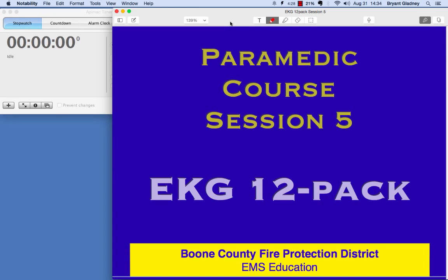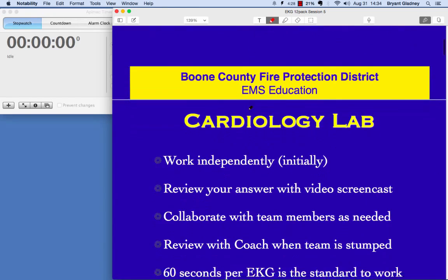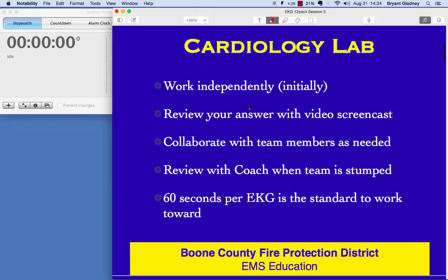Okay, here's an EKG 12-pack for session 5 of the paramedic course. This is a cardiology lab session. We're going to work independently to start with, and then review your answer with this video screencast. Then collaborate with team members as needed to check your work and get any feedback from them. And then if you're totally stumped, then you get a coach involved.